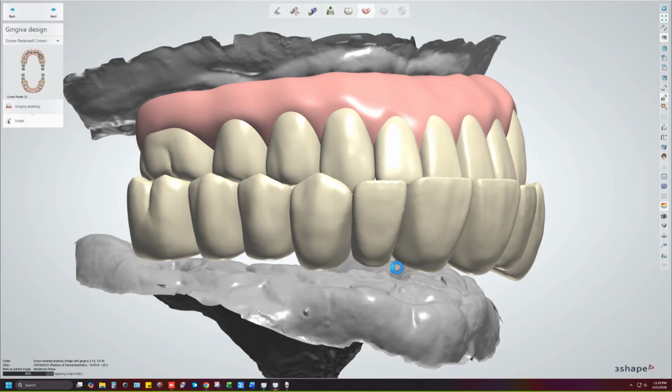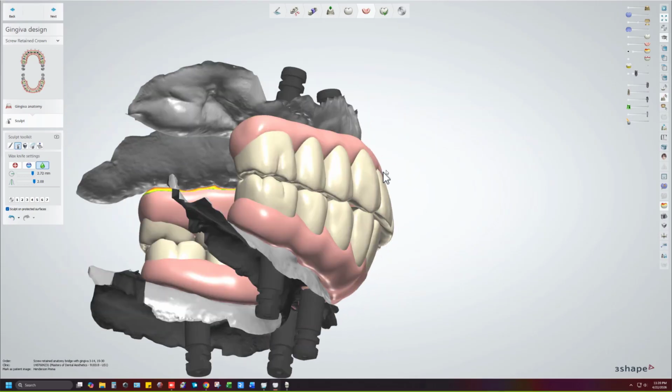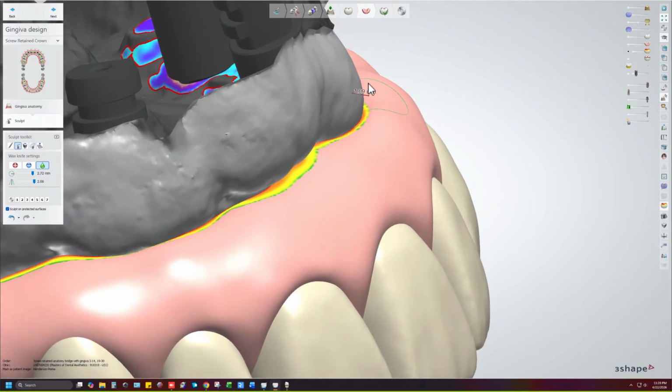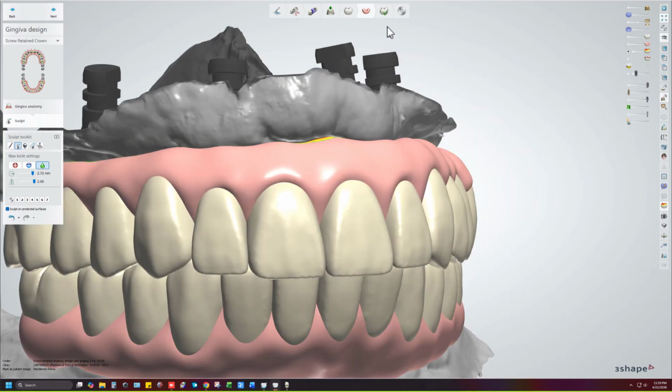Now we're going to move forward into finals. So we're going to probably do an I-bar from the DESS library. We're going to go ahead and take this segment of bar out and do an upper and lower double I-bar. And yeah, it's going to work out really well. We already have 0 adjustments, so what do I have to do? I just press F7 and go. You can see here, there's still a little bit. I will probably, before I finalize the I-bar, come back here and cut this tissue back a little bit more for the glass.